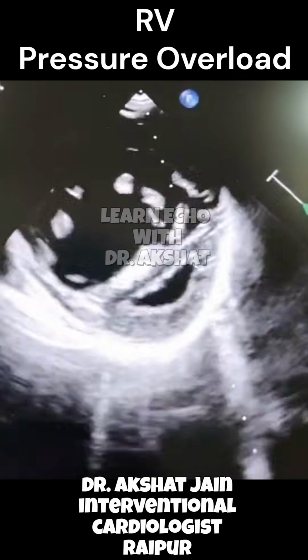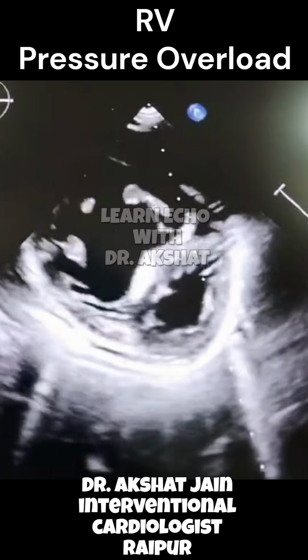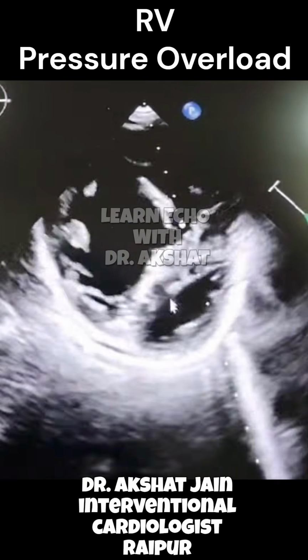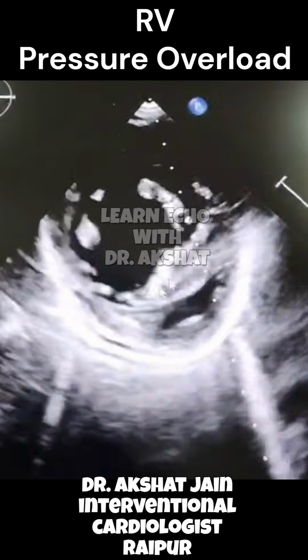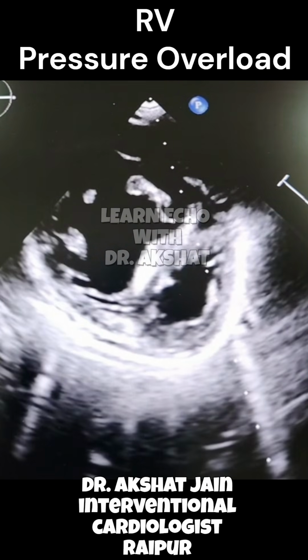So this is how a dilated RV looks in a short axis. But what is more important is that if you see in this video, the LV with each contraction or systole is becoming D-shaped. Or you can say that the RV is pressing the interventricular septum towards the LV during systole. I will just play it frame by frame for you to understand.